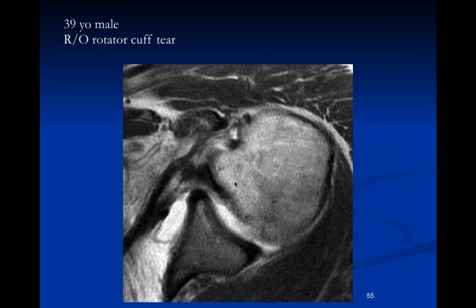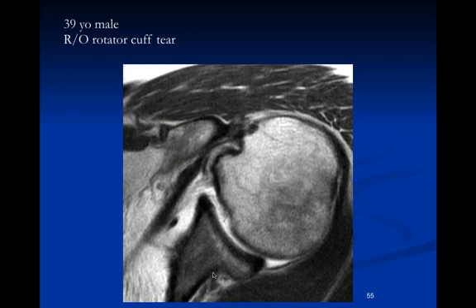Male with evaluate a rotator cuff tear, the axial T2 image. The patient's humerus is internally rotated. Yeah, this is markedly internally rotated because you can actually see that the biceps tendon, instead of being out at 90 degrees, is really very anterior in this location. And you can see there's a lot of disease of the subscapularis tendon coming in through here. In this particular location, we're not quite in the right location to see the coracoid process, but we can see that there's a subscap tear.